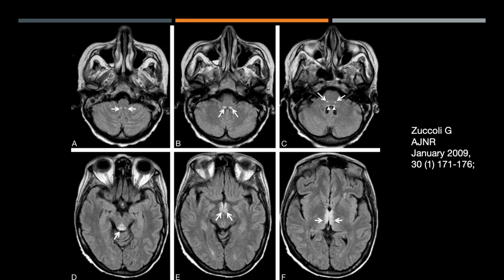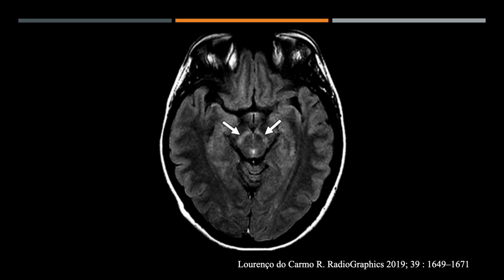What is the diagnosis? Here we have periaqueductal gray involvement, and also you often will see involvement of the mammillary bodies. You can even have encephalitis of the midbrain. It's a diagnosis that we're going to find by other means. So we have MRI, and then a lot of these patients are going to require lumbar puncture to get more specific diagnosis. So this is an encephalitis, a viral encephalitis involving the midbrain. Bilateral symmetric, it's going to be a hard one to notice.